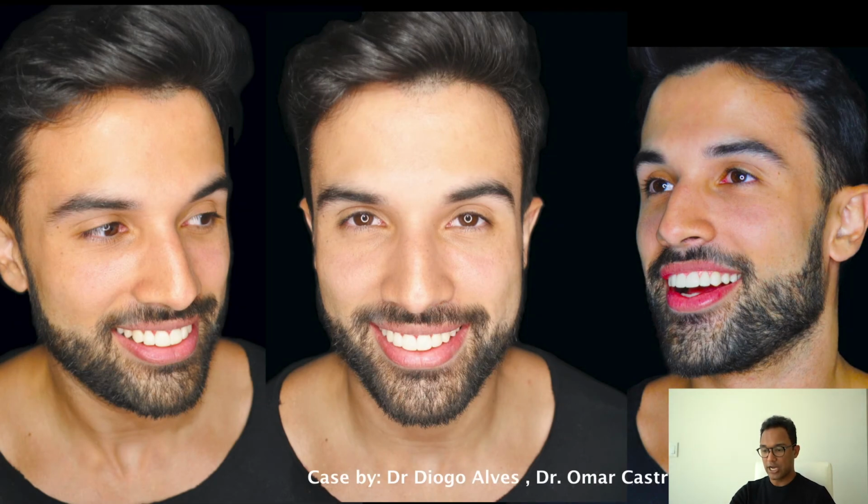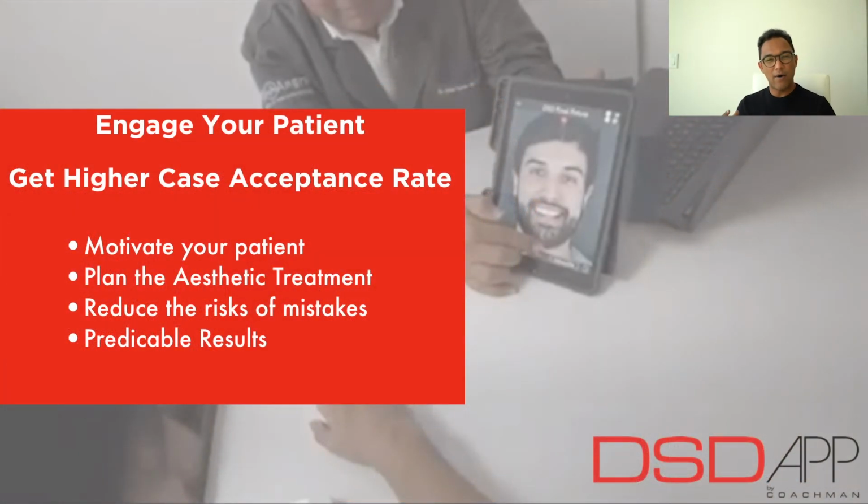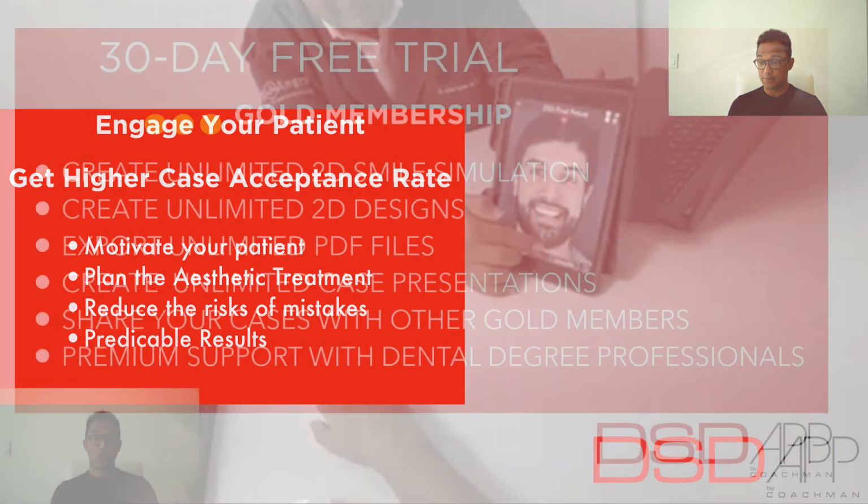Here's another shot. So just so you can see how powerful it is, all of those teeth were selected from the DSD app. So here you can see how amazing it is and how you can engage a patient to get a higher case acceptance rate.